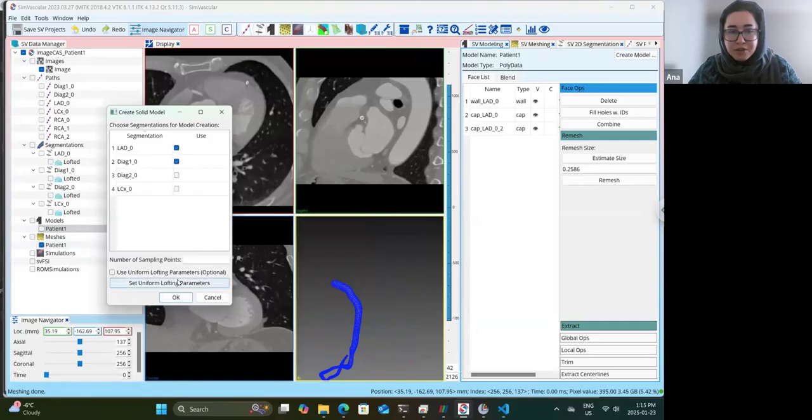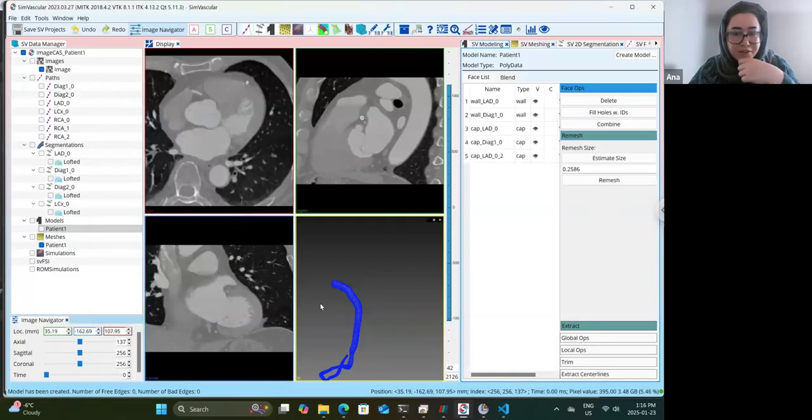When you get an error while you're running the mesh, the problem is that you have no idea which one of these vessels is making that error. So this is why I need to go back. I start with one vessel and add the other vessels step by step so that I can understand which one of the vessels made the problem.